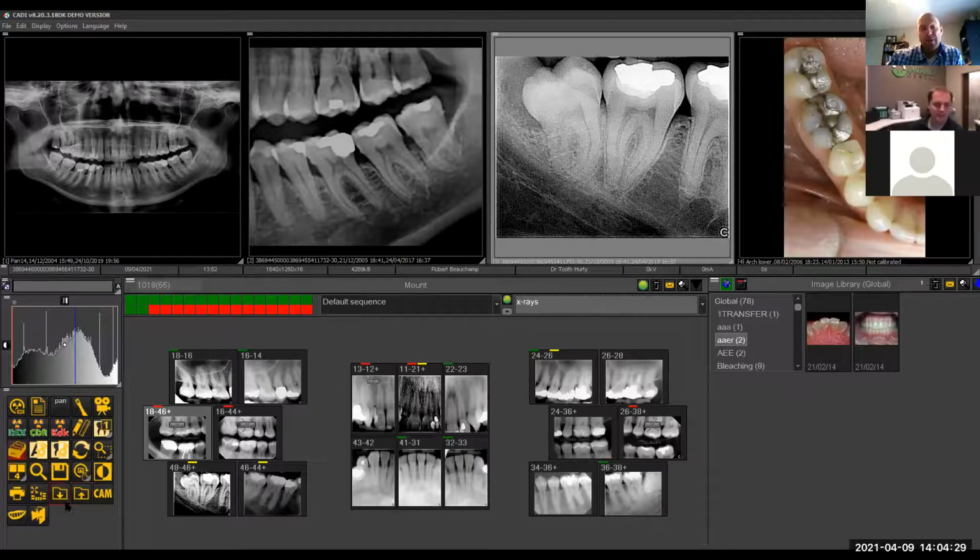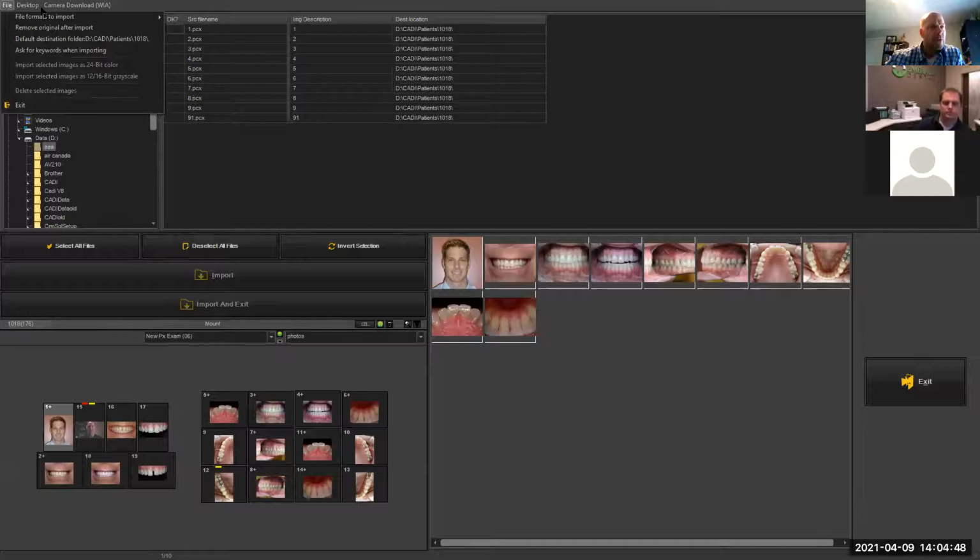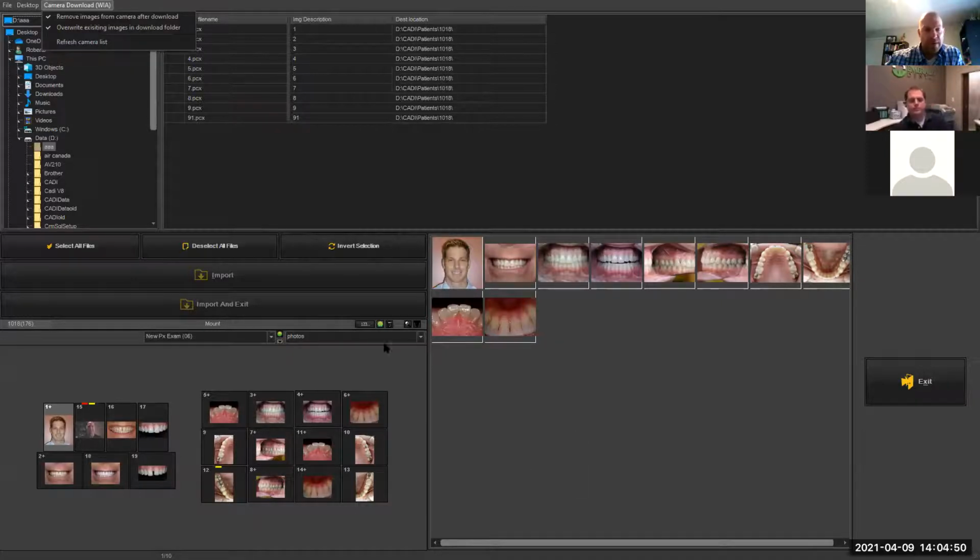Yeah, so you can import and export. Even when you import images, let's say you do get somebody that brings images digitally, X-ray, whatever. When you import the images, you can choose the format as well to being a grayscale type image. So where is that? Oh no, sorry, it's not the import picture directory. It's import. Let me just move this around here. Put that back up. Let's just cancel out there.